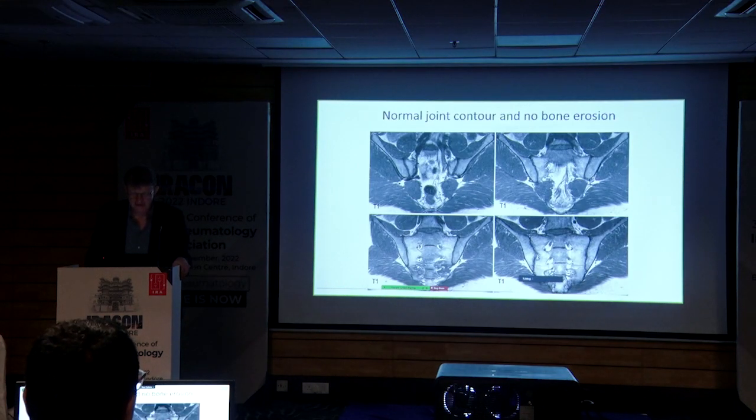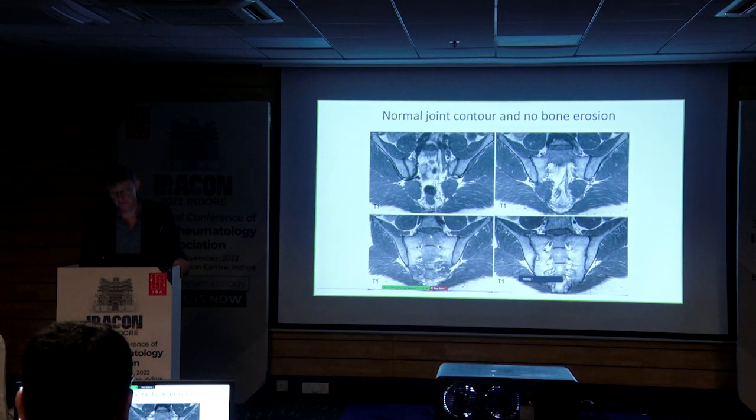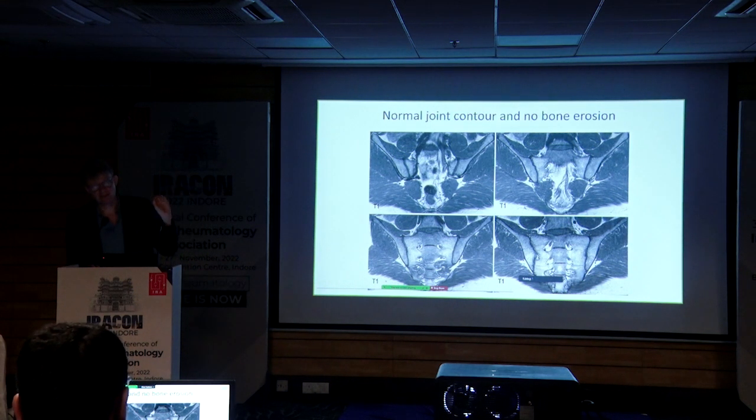And this is again the same image as I showed you before, the normal joint. And here you'll see that there are not these irregularities here. There is a cortex running nicely down here, and there are no holes into the fat there. Again, I will draw attention to the fact that you may have changes at this place where you go into the ligamentous part of the joint, the hole in the boomerang.